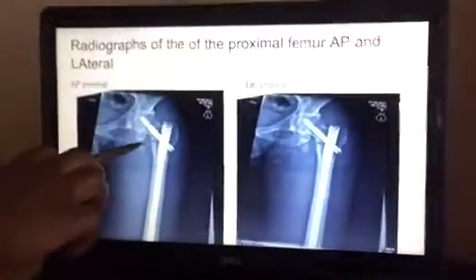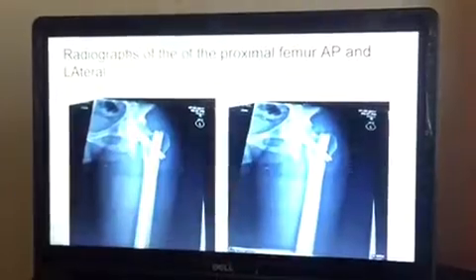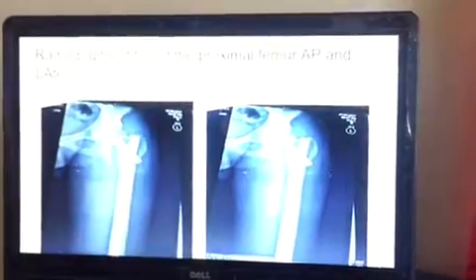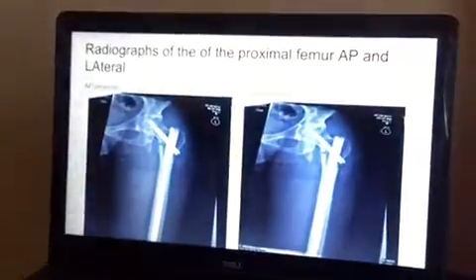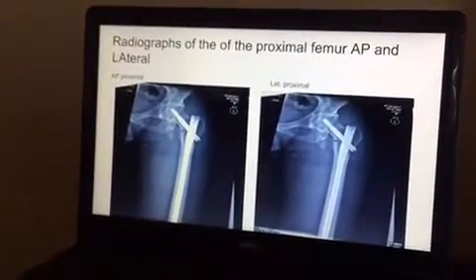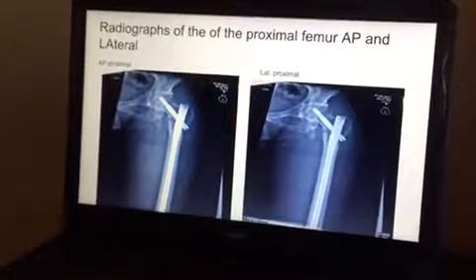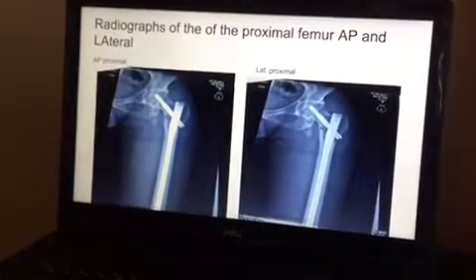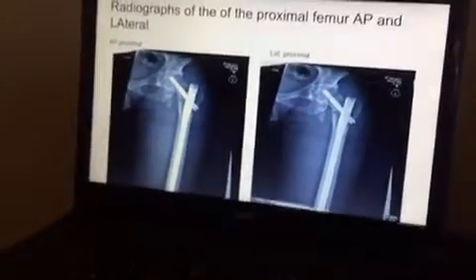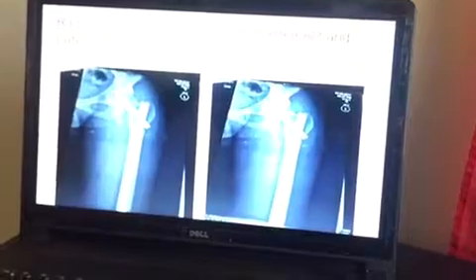So this is the fracture of the intertrochanter right here, so multiple fractures of it. They have intramedullary rods and nails. According to Medscape, they are means of fracture fixation in which a long metallic implant is inserted at one end of a long bone through the medullary canal.